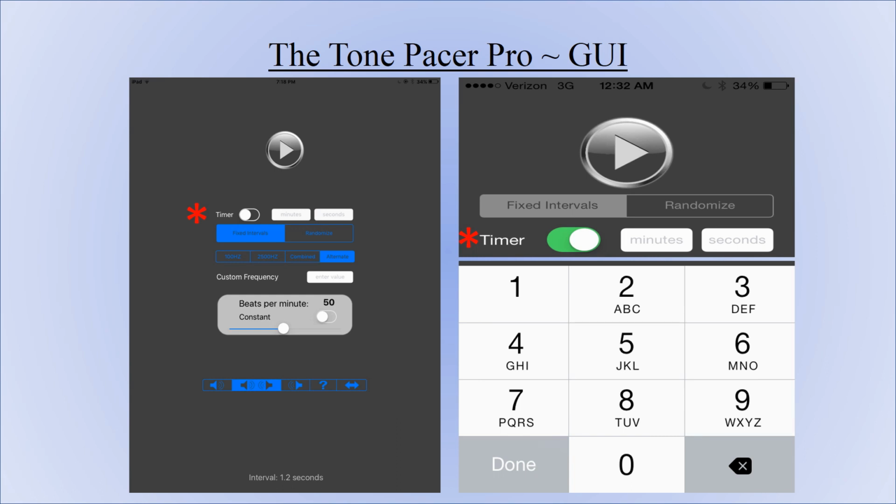This is the Tone Pacer Pro graphical user interface. Now it varies slightly between which version you're using, if you're using the application designed for iPhone or if you're using it on a tablet, but the basic functions are all similar. Here you see at the asterisk is the timer function. To activate the timer, you slide the timer button to the right and the timer indicator will turn green.